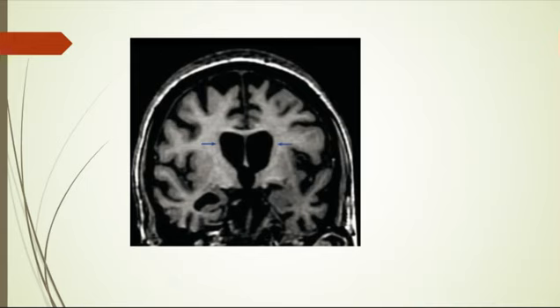Small caudate. Come on, guys, girls. No, it's not Yabani. Huntington disease, exactly. Huntington is not a Japanese name, it's a Western name. So what's the sign? It's a boxcar ventricle.